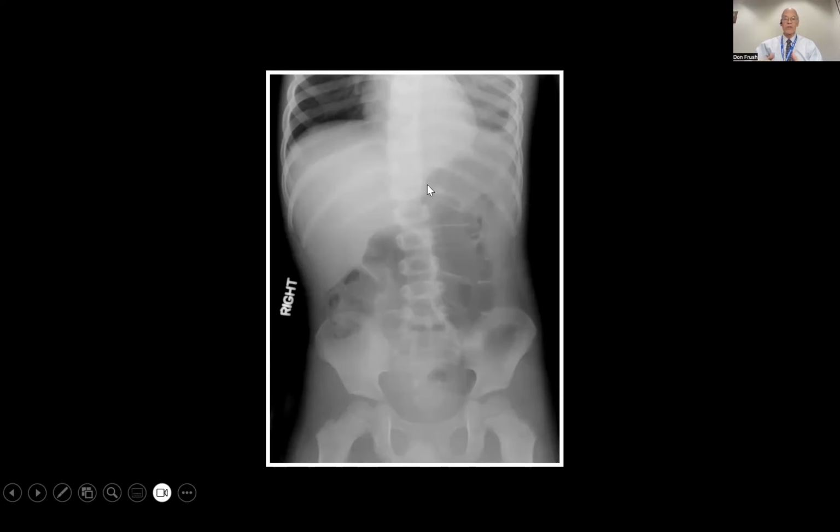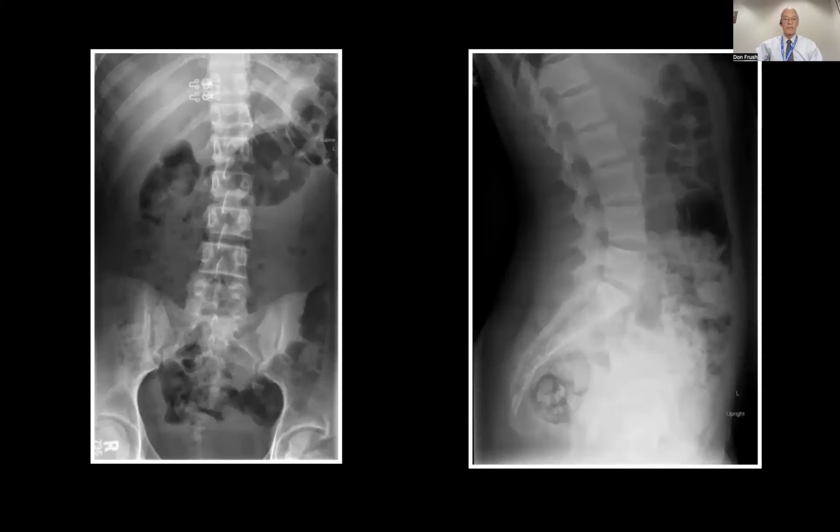And what I'm showing you here is just to remember 5, 4, 3. Look at the 5 areas in chest, 4 in the abdomen. Make sure you're not overlooking anything. And then I'll talk about extremity films here.